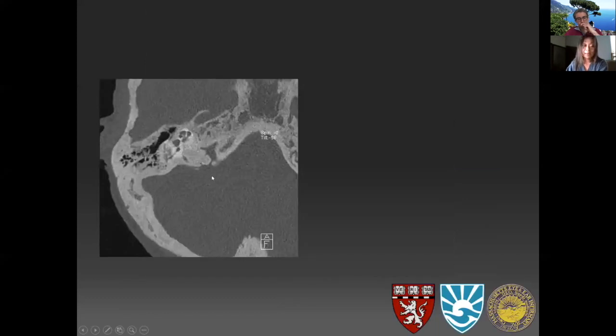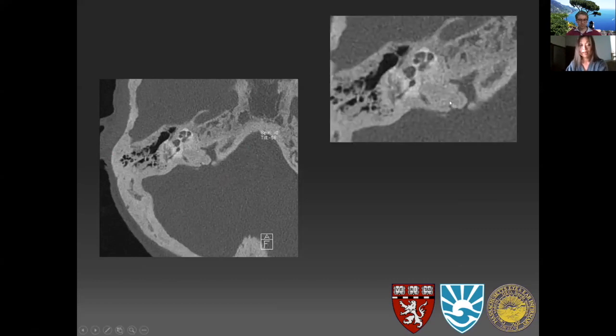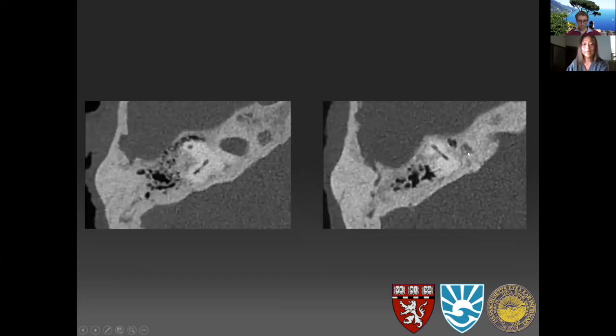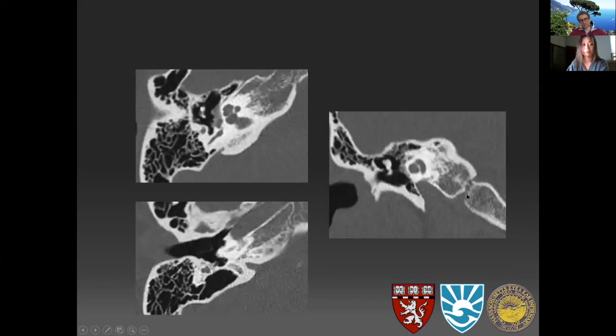Here's another companion case, which is not otospongiosis, not otosyphilis. If I told you this was an older patient, you can see all the bone is diffusely coarsened and thickened. It is a bit hypodense, but this is Paget disease. So this also does not only select out for the otic capsule, and certainly not the middle layer. It's all over, and it's coarse and diffuse. Here you can actually see it's going along the subarcuate canal below the rainbow of the superior semicircular canal.